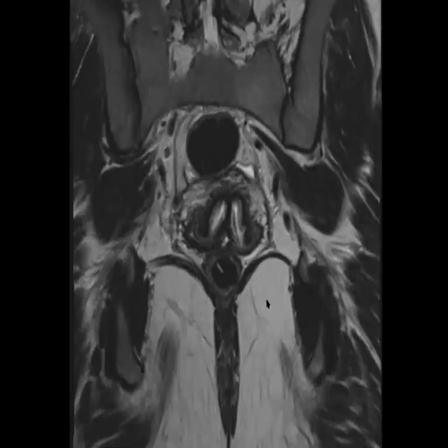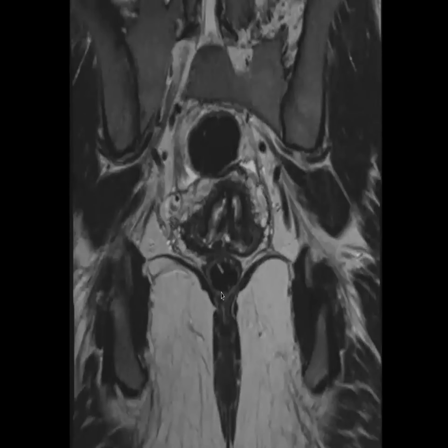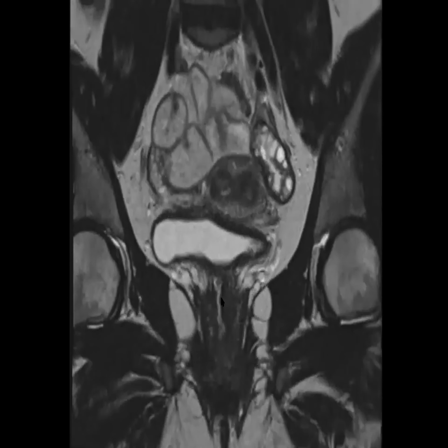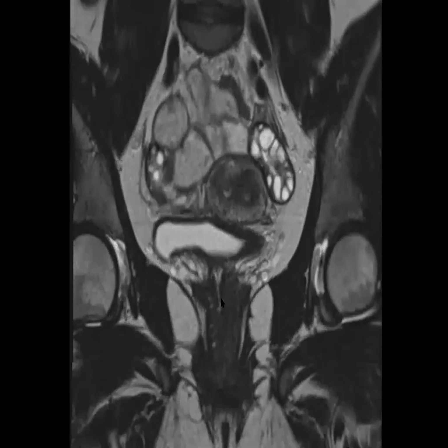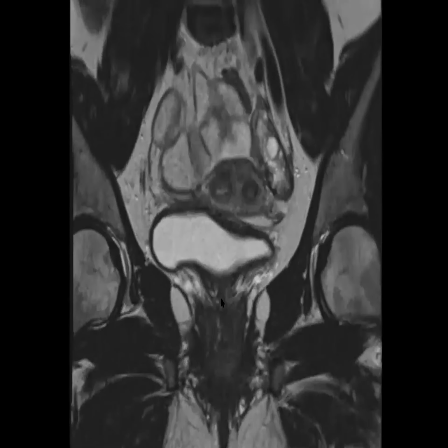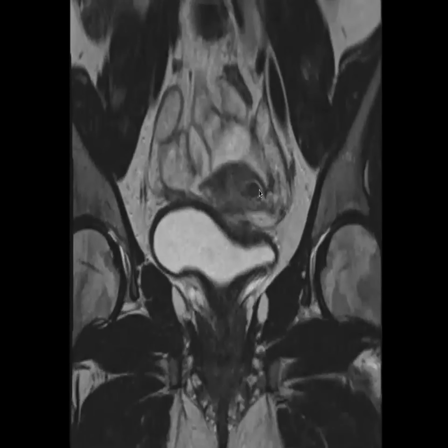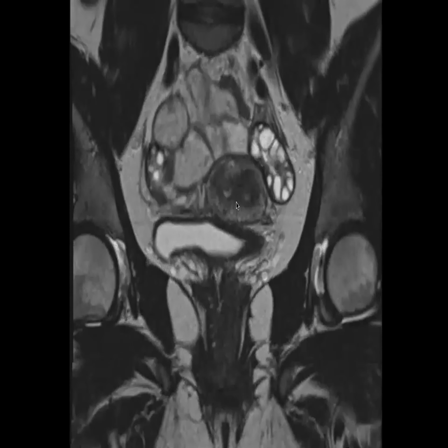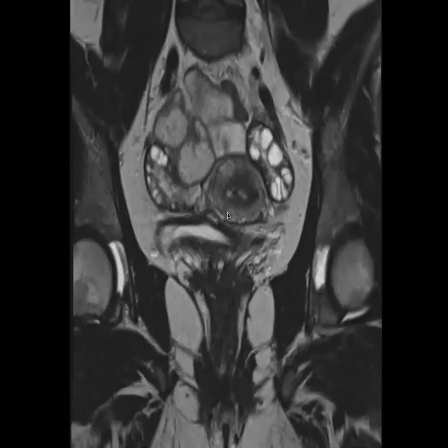This is one of the key images. We're looking at the uterus. And there is a uterine abnormality. Okay, so Kadar is saying septate, which I agree with because of the outer contour here, and I can show you on the sagittal, but there's no divot between the two horns.